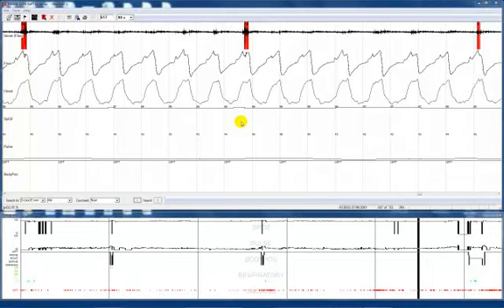This video will discuss clinical waveform interpretation and report interpretations for the MediByte JR software. If you work at a sleep laboratory, this video already probably covers most of what you know. However, if you work in a dental practice, this video will help you to better understand some of the clinical data captured by the MediByte JR and how to better understand the clinical data.